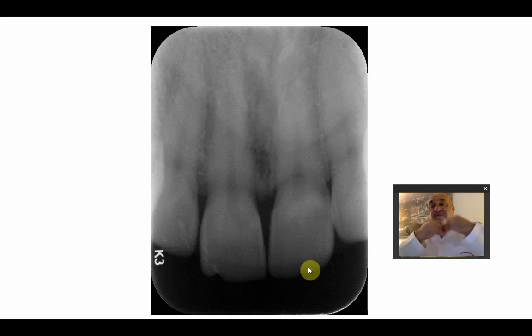So please, before you jump to a wrong conclusion that we have some decreased radio opacity on the crown, let us first consider that this is air present in this area, which will allow more X-rays to pass compared to the lip. The lip is soft tissue, but it will still be shown on the X-ray because it will stop some of the X-rays, thus it will be more grayish rather than white in appearance.